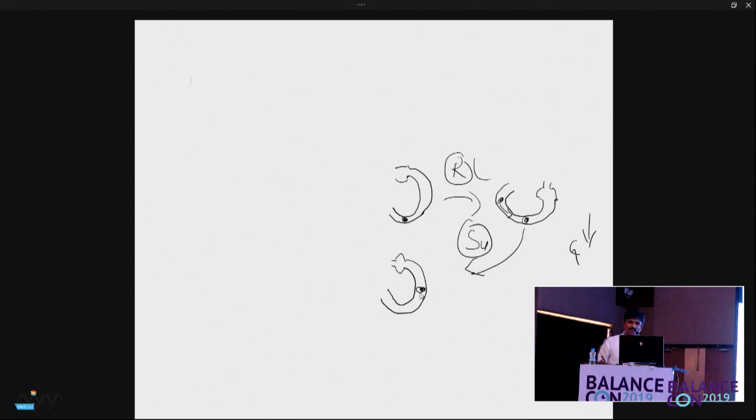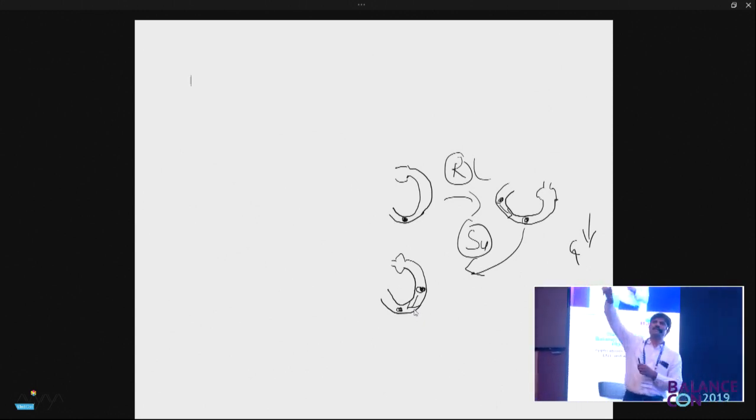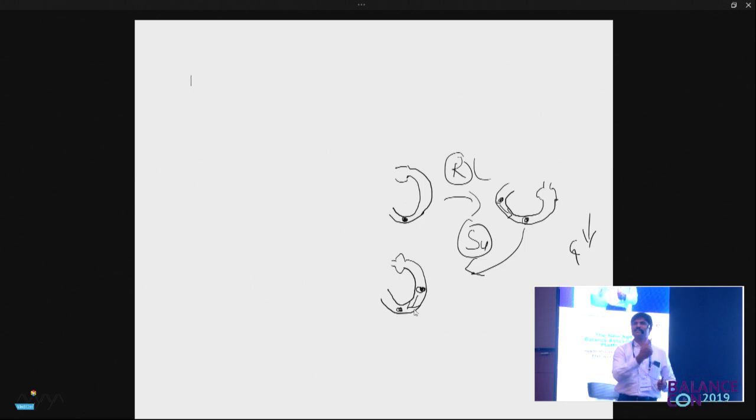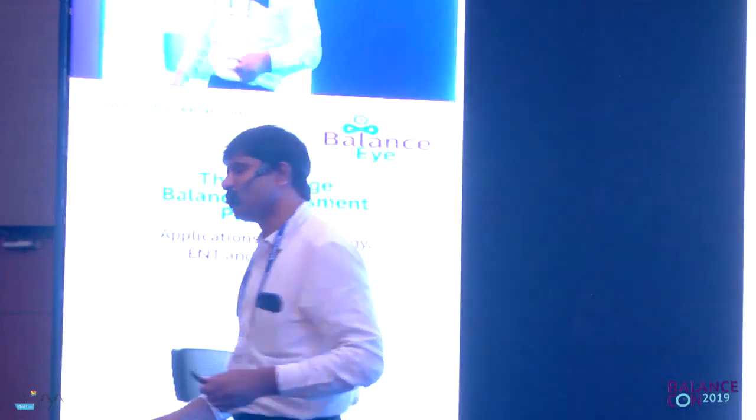Now from here, it has to again go back to the most gravity dependent position. Yes or no? So, I was to my right. Now I go back to the supine. So the debris starts moving like this, which means the eye slowly starts moving to the right. The beat direction should be to the left. Do we get that?